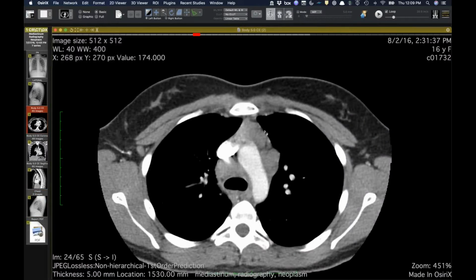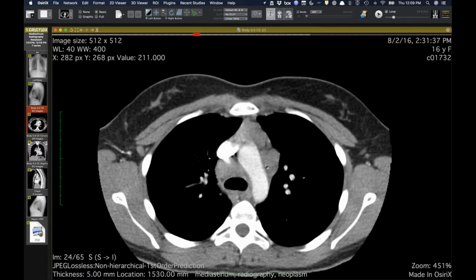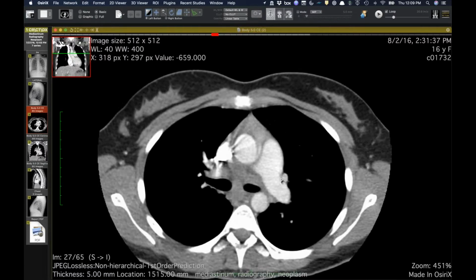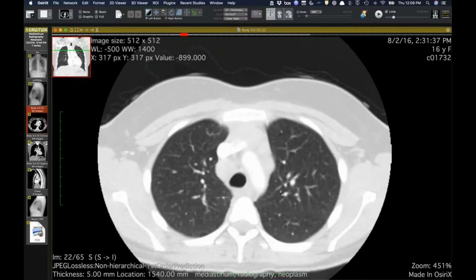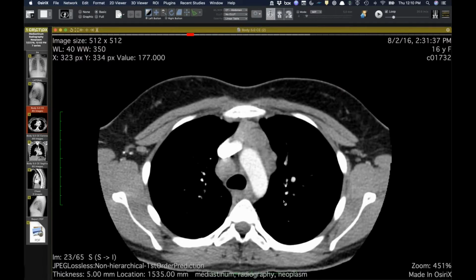But I was a little bit nervous about looking at this because I thought maybe the fact that there's so much more in the anterior mediastinum would make you argue against sarcoid. But other than that, so that's thymus. Yeah, you're right. Any chance it was a sarcoid reaction to the lymphoma, or did they actually biopsy the mediastinal node too?